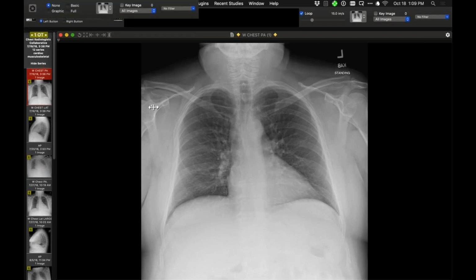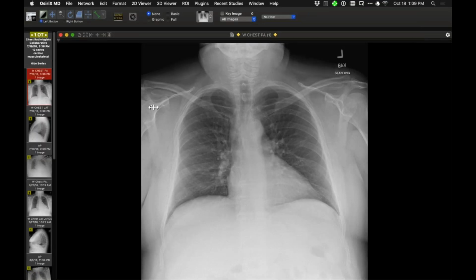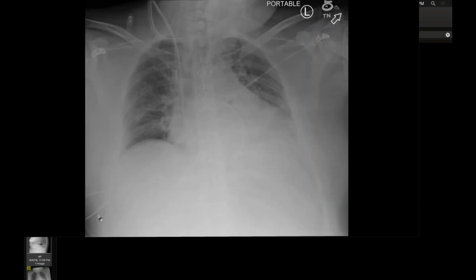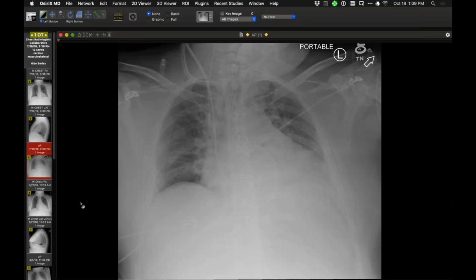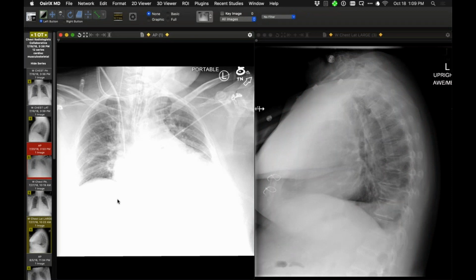Here is a case that, if I remember, Trevor showed an example of once before, maybe quite recently actually, so he'll remind me. So this is a time X when the chest has not been operated upon, and on the 20th, next day, the patient is just post-operative. We see the usual things, including the sternal wires. Now I'm going to show you an exam from the 27th, after the patient has obviously left the ICU.